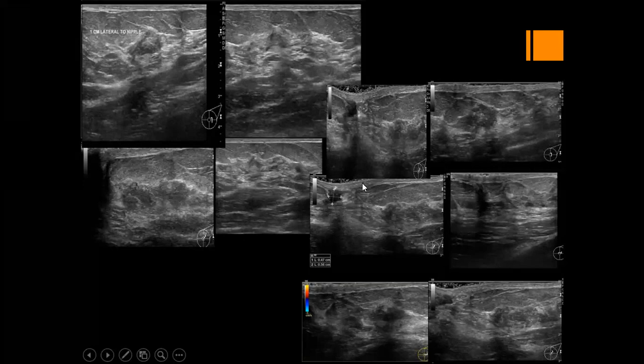But I was not sure if it was there and passed over, or just a new area. Because on mammography, that asymmetry persisted, a small area just behind the nipple. But with meticulous searching, we could appreciate these irregular lesions just behind the nipple, which makes it more suspicious.